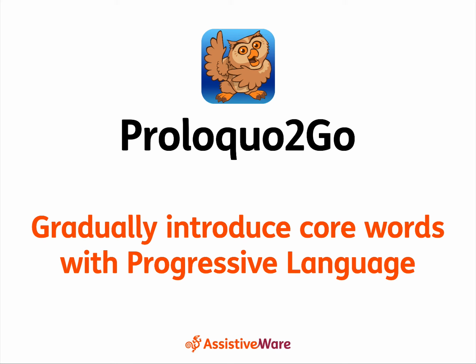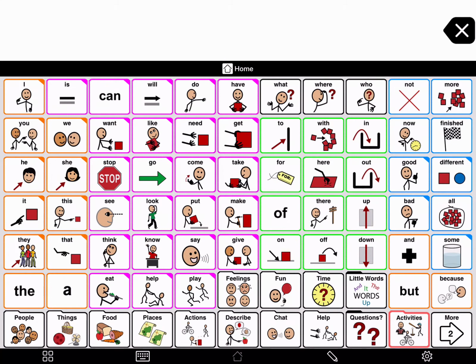Gradually introduce core words with progressive language. Progressive language is a feature of the crescendo vocabulary that will help you slowly introduce language to an AAC learner while keeping the location of all the words in the same place. You can enable progressive language in options for any user with a crescendo, intermediate, or advanced core vocabulary level.